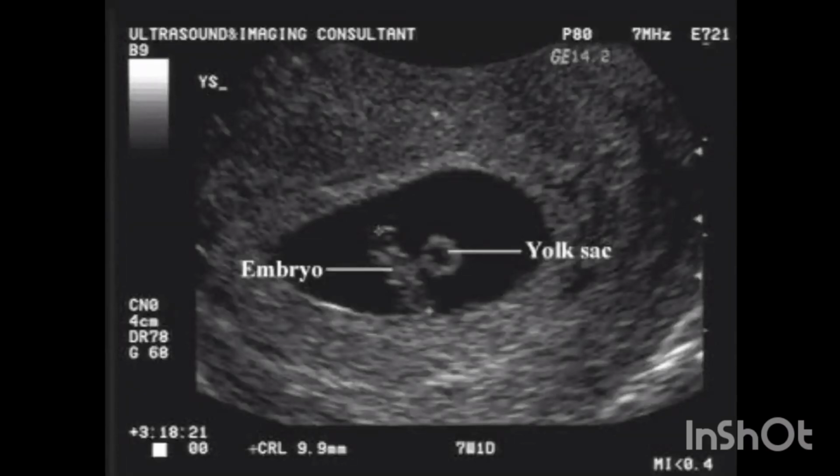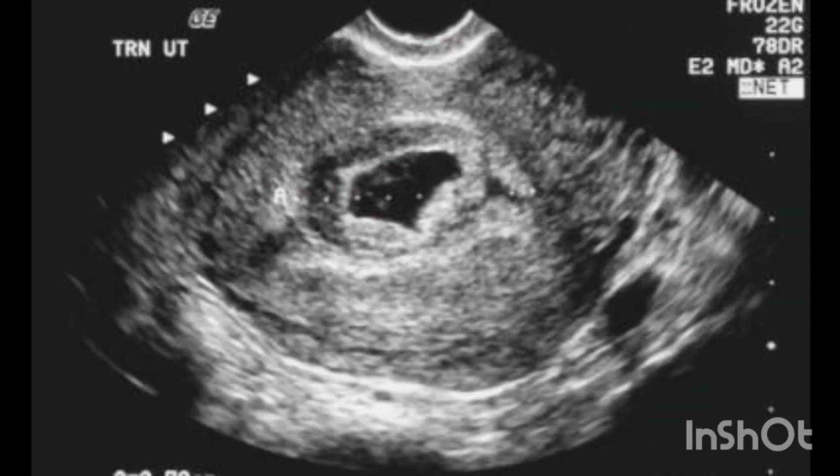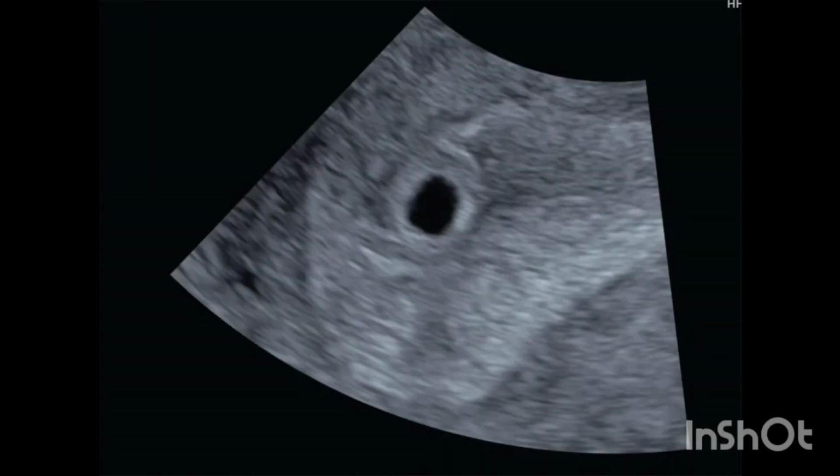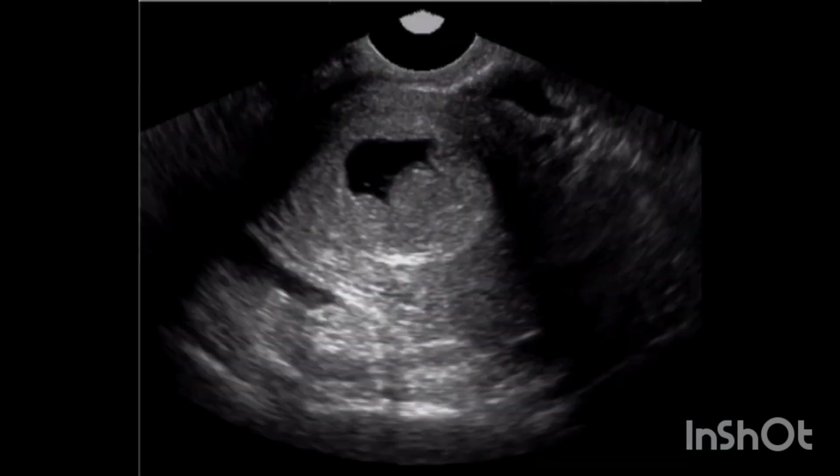Ultrasonography is a commonly used tool to evaluate the status of pregnancy. Complications arising from pregnancy are frequently encountered complaints in emergency departments and prenatal clinics. Though home pregnancy tests are increasingly popular, some women may discover they are pregnant for the first time in the outpatient setting. A true gestational sac can be distinguished from a pseudogestational sac by noting these points.